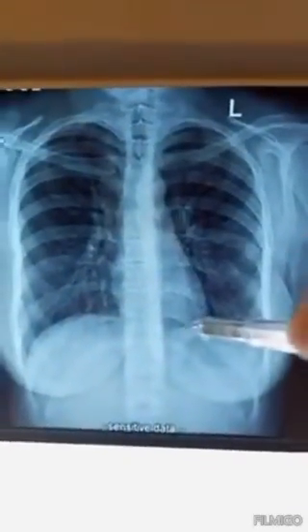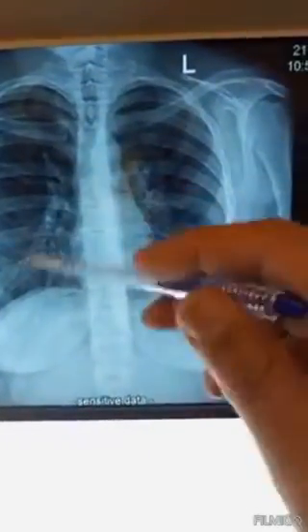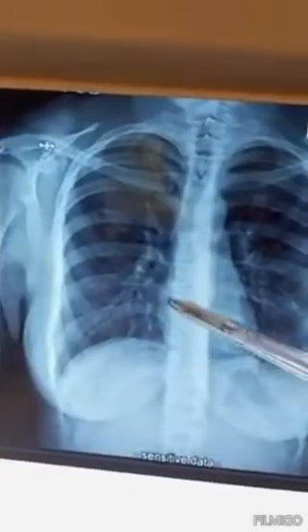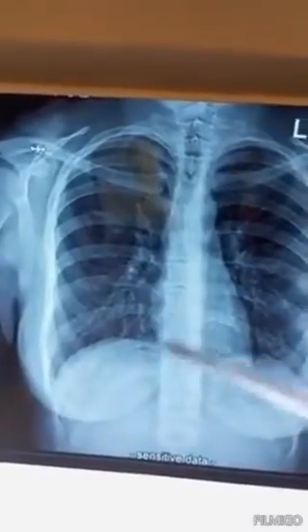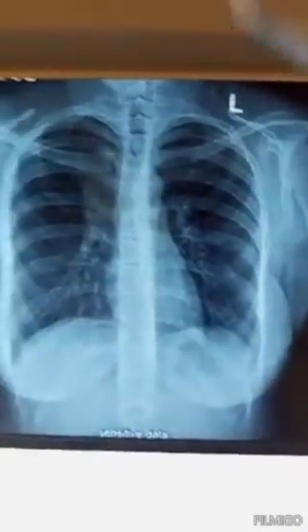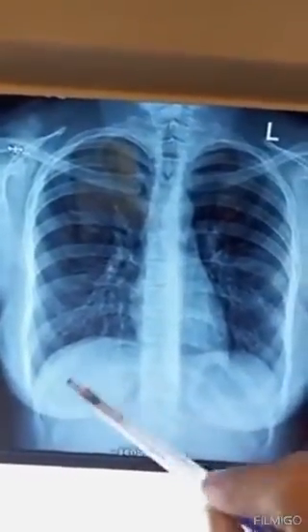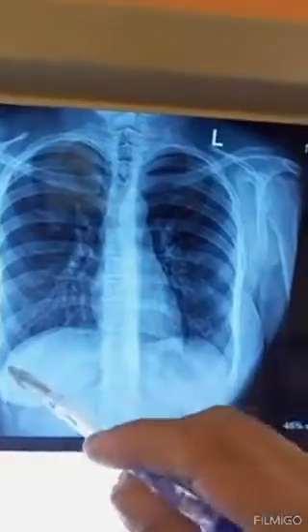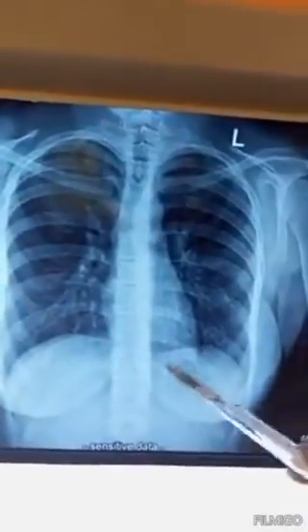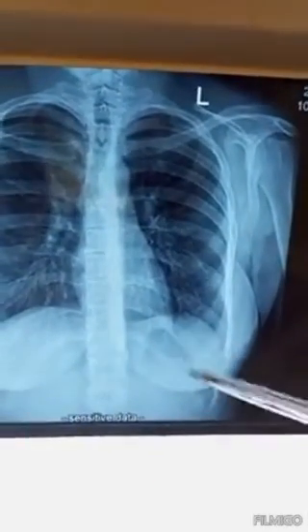All right, so comment on A, airway, breathing organs, C, the cardiac shadow and the cardiophrenic angles, right? This is the cardiophrenic angle and the costophrenic angle. And then D, the diaphragm. This is the right dome of the diaphragm. Below it is a solid organ, the right liver lobe, and this is the left dome of the diaphragm. There is the left lobe of the liver with the stomach.